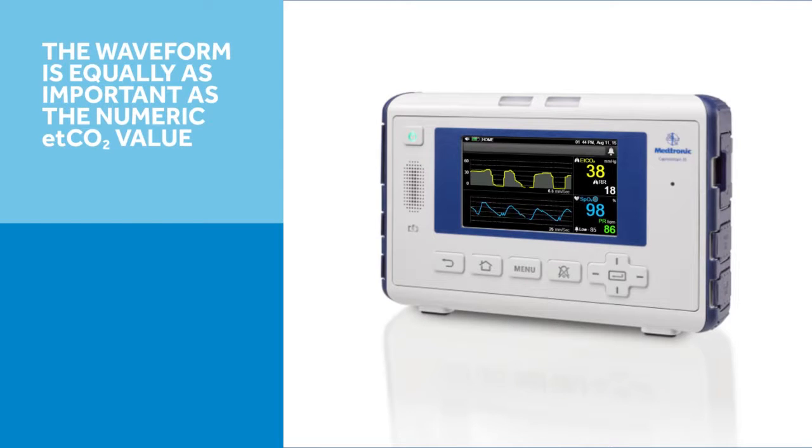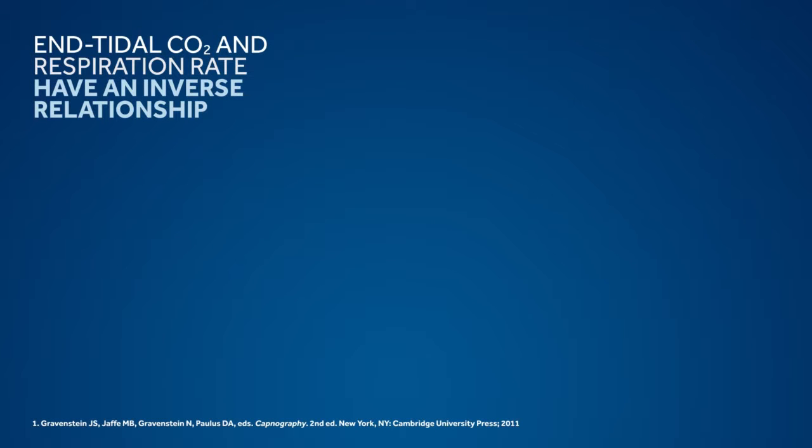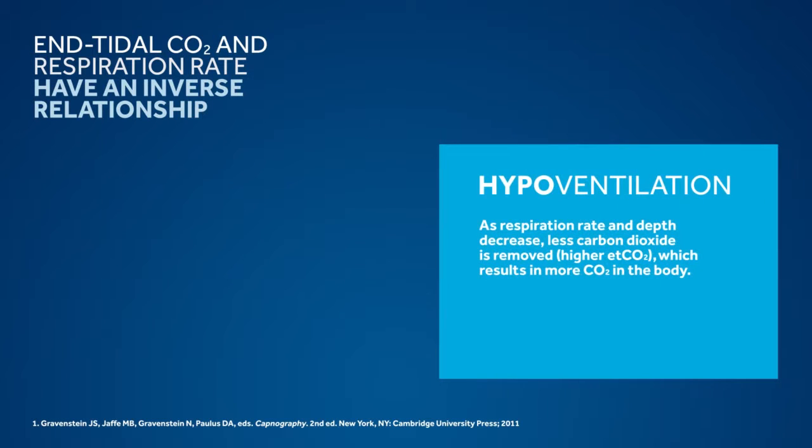In addition to the numeric EtCO2 value, the waveform display shows a graphic representation of the inhaled and exhaled partial pressure of CO2 in each respiratory cycle plotted against time. The CO2 waveform changes immediately when there is a change in breathing. That is your first indication of a possible respiratory problem, and it can potentially enable you to make a timely intervention. End-tidal CO2 and respiration rate have an inverse relationship.